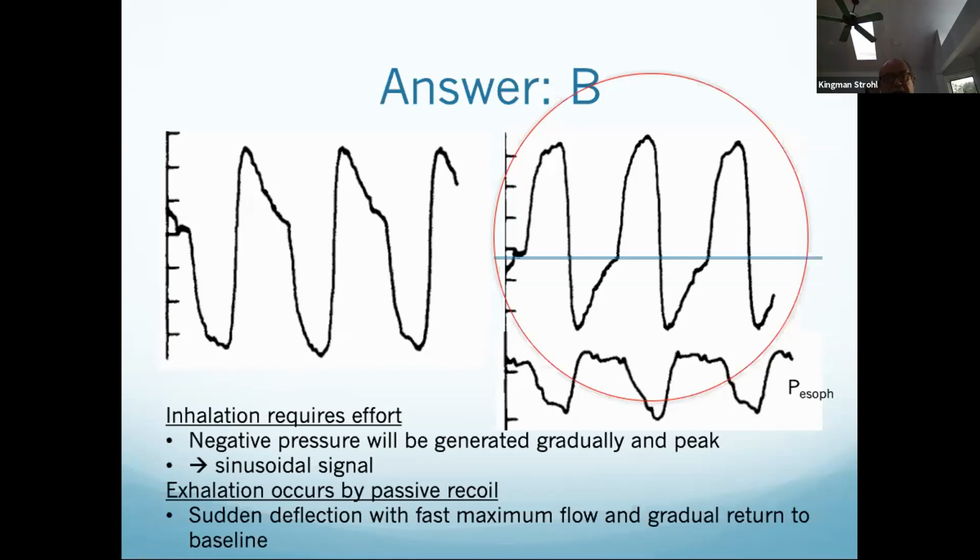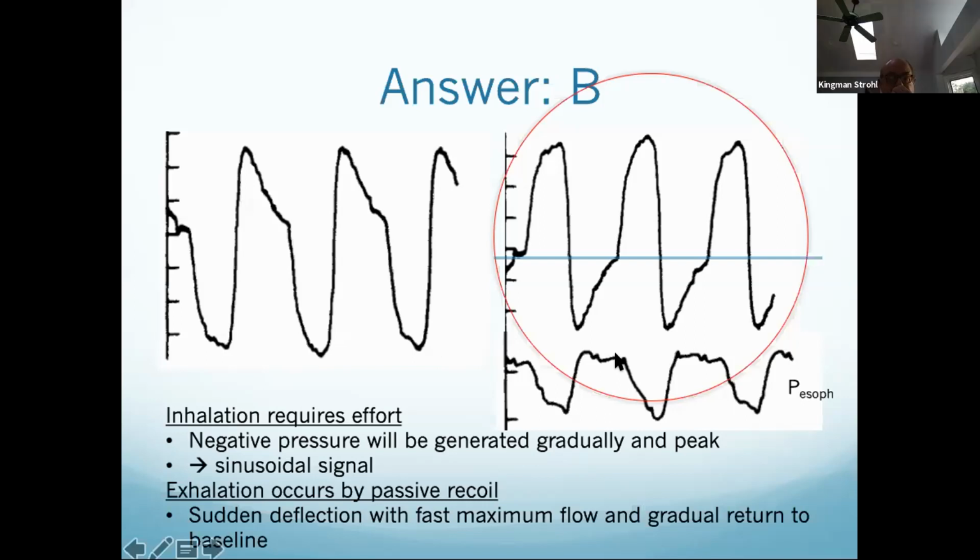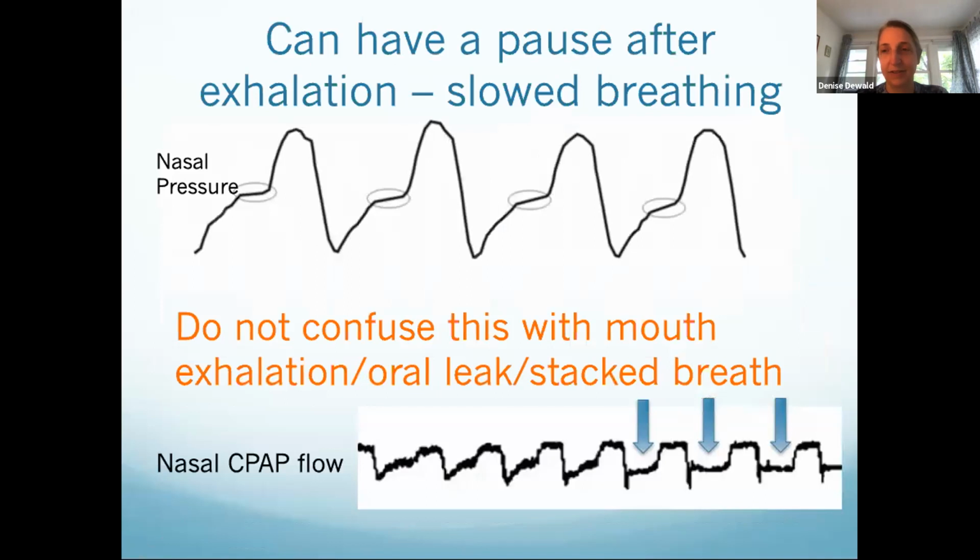So the other thing to note is to see the peak flow. Where's the peak esophageal pressure? At the end of inspiration. And it's different because you have your elastic recoil of the lungs and chest wall. But you breathe up and up, and then whew, then go all the way down. All right. So if you were in 1981, fellows would be putting on esophageal probes, making the balloons and putting them down into people to be able to detect obstructive apneas from central apneas.